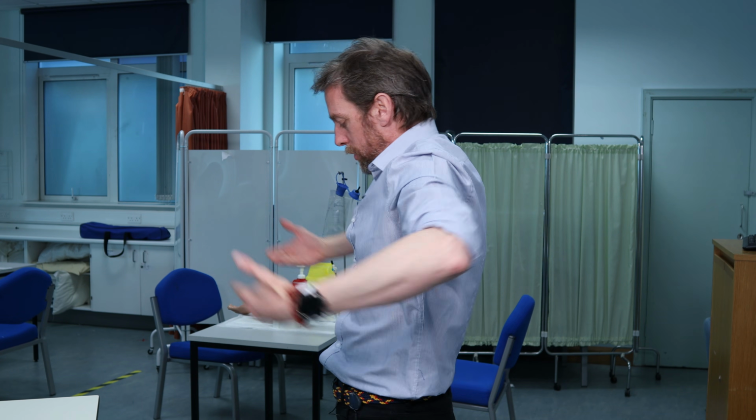Anyway, today we are going to look at transverse sections or axial sections through the abdomen as CT images. So we're going to do some radiology. And there are two good reasons for this. The obvious one is so you can recognize anatomical structures on CT images.